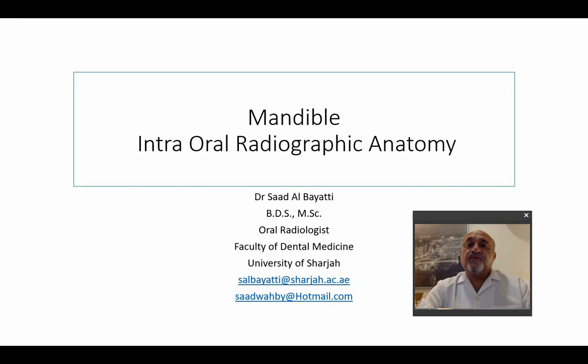This is mainly because of the superimposition of structures in this 2D type of imaging.